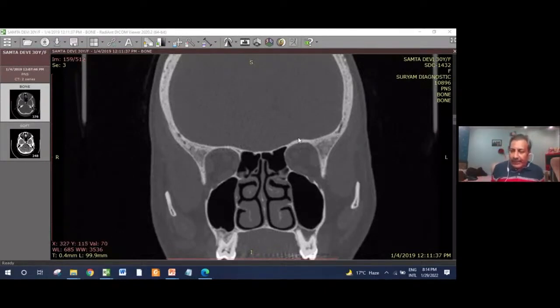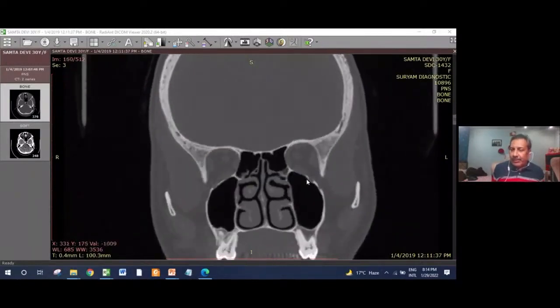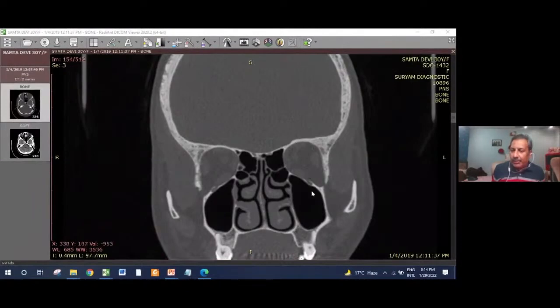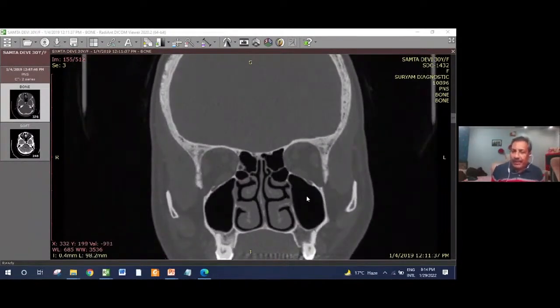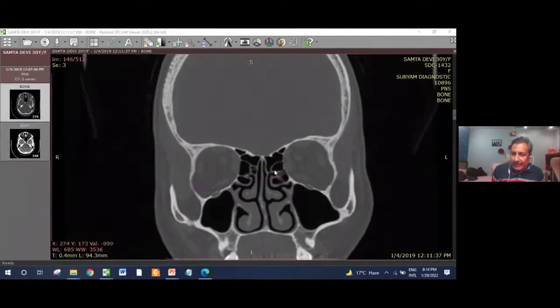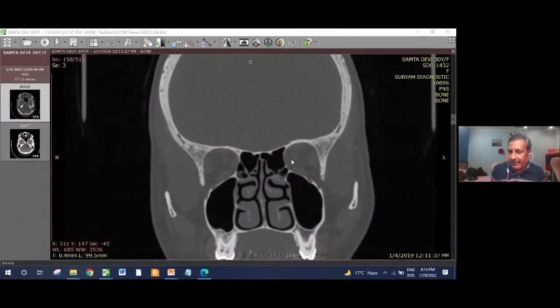This is your orbit. The orbit is reducing its size. See anteriorly, see posteriorly. As you go behind, the shape of the maxillary sinus is changing now from a globular shape to a more and more oval shape. Now see behind this ground lamella. Now the cells appearing are much less in number and larger. See this, such a big cell.